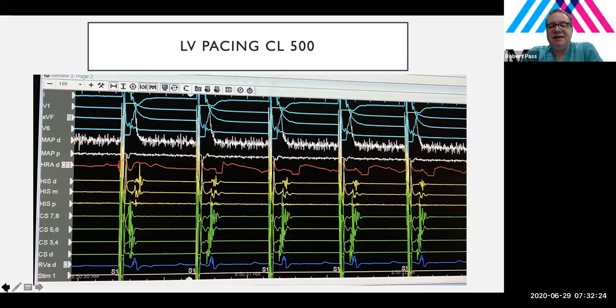versus having to map in tachycardia, which was in this particular case strange, that's why we call it a hidden concealed pathway. Because a concealed pathway, remember, only means that it conducts from ventricle to atrium, but not from atrium to ventricle. And it is called concealed because when we look on the surface electrocardiogram, there's no evidence that there's an accessory pathway.